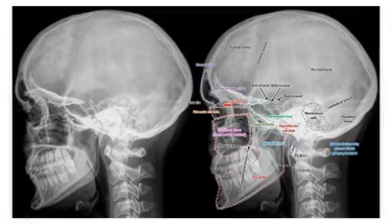So an important question over here is the count of the vertebrae. You have to count the vertebrae. So you can see this is the cervical 1, then this is the cervical 2, cervical 3, 4, 5. So you have to count from above to downwards.